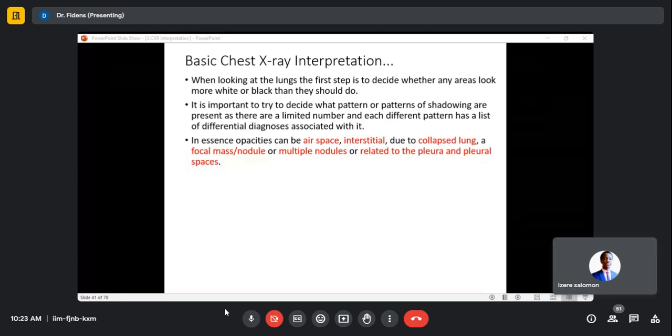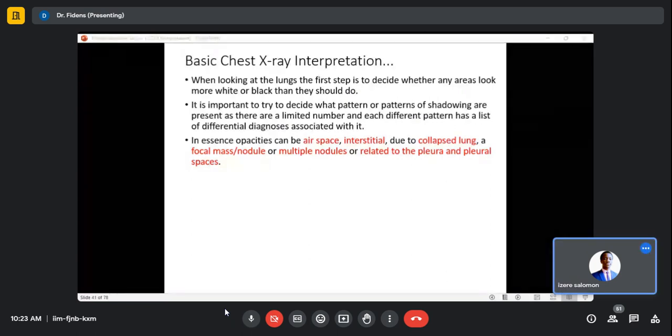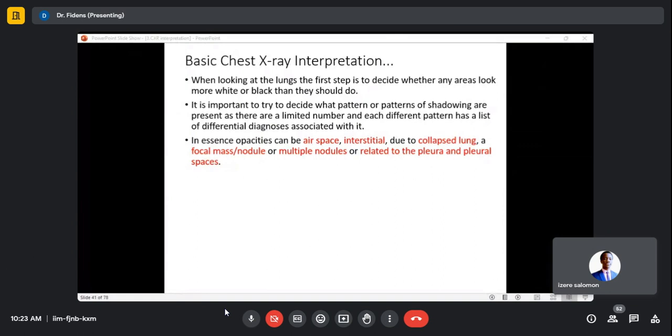Fluid where? Sorry. Within the lung. And when can you in your report say this is pneumonia? When can you use consolidation? When can you use pneumonia?